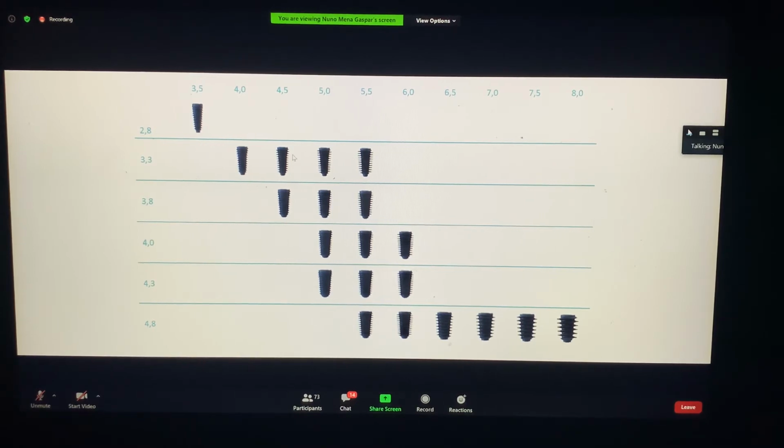Okay, so this will be a 4.5, a 5, and a 5.5. Và đối với implant Enrich thì sẽ có rất nhiều kích thước khác nhau và nhiều loại ren khác nhau ở cùng một loại lõi 3.3, nhưng mà chúng ta lại có rất nhiều dạng kích thước đường kính implant từ 4.5 đến 5.5, và đặc điểm khác biệt ở đây không phải là cái lõi, mà đặc điểm khác biệt ở đây là bề mặt của ren càng ngày càng xòe rộng ra.